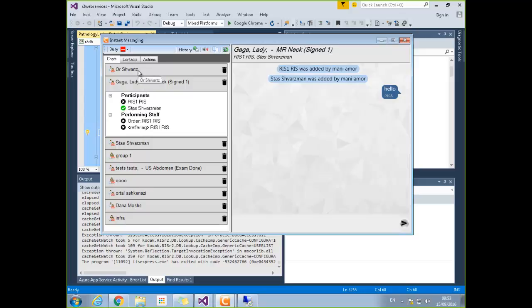Will that be an indication of how many chats? So if somebody wrote you 3 times, there'll be a number 3 next to your chat. Not yet. For now, we have just the number of new messages in the bubble. Yes. In each chat. Yep. So if you have 4 new messages in one chat, it counts as one.